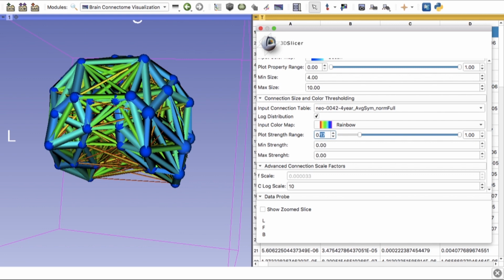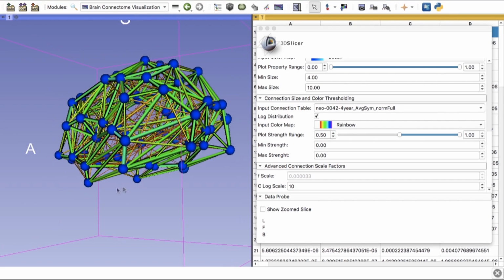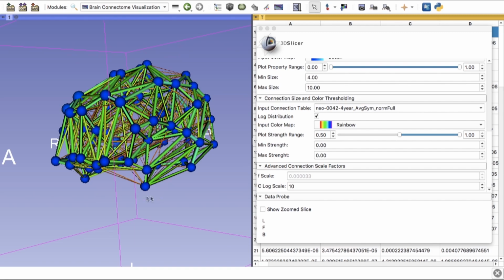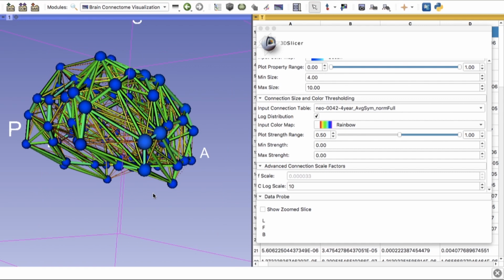So we have a bigger filtering range available. So now if I filter it a little bit more, okay, there are no connections, so we have to just look for it. That means that they're located below, maybe at 0.5 or something. There we go. Okay, so this is pretty nice. And once again, we can turn around. Voila. It's really cool. Yeah, so this is pretty much it.